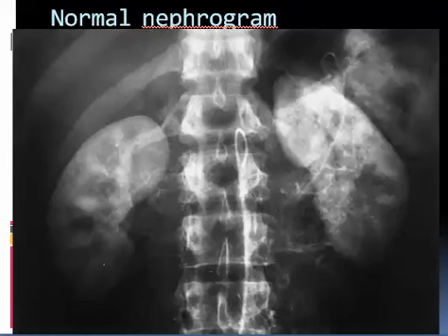Now this is an vascular examination, or an angiography for the aorta, showing the contrast after the cortical vascular phase going into the cortical nephrogram phase. We can see clearly that the cortex is delineating relatively negative medullary portions or pyramids.